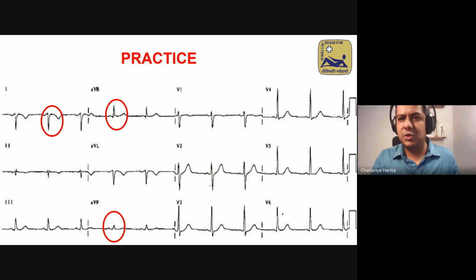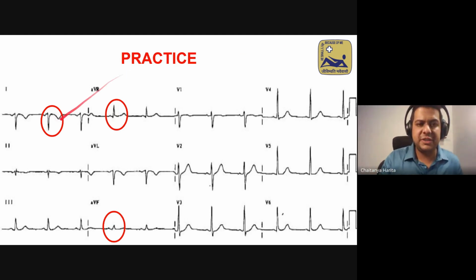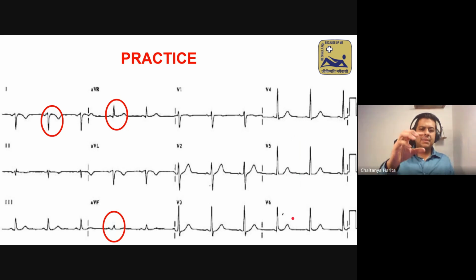Now I am saying this is dextrocardia. Dhwani says it's wrong placement of leads. The nurses have misplaced aVR and 1. If you compare to the earlier ECG which I showed, Dhwani, in V4, V5, V6, the R waves are becoming bigger and bigger, which is normal. In the ECG I showed, from V4 to V6, the R waves became shorter and shorter and shorter.